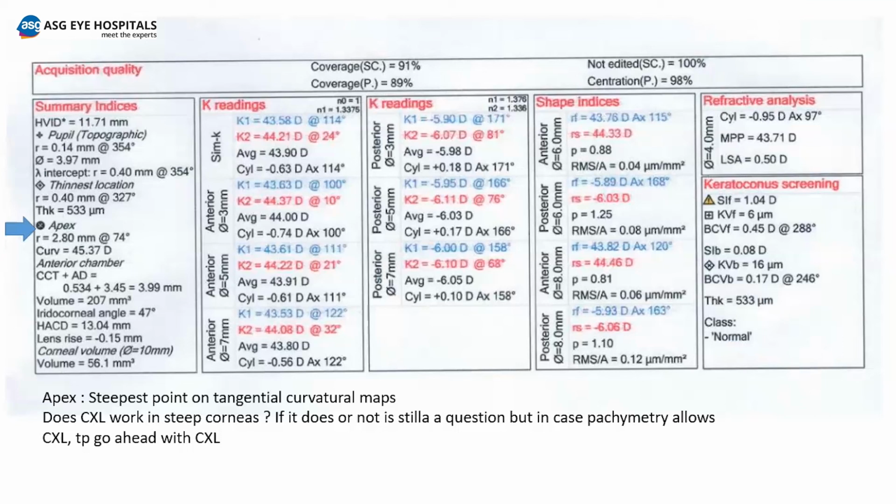The Kmax and the dioptric values have a difference of roughly 0.7, and the pachymetric values have roughly a difference of 10 to 12 microns. So that is there, but apart from that, it is quite comparable. If you just ignore 10 microns here and there and 0.5 to 0.7 diopter here and there, they are very comparable.